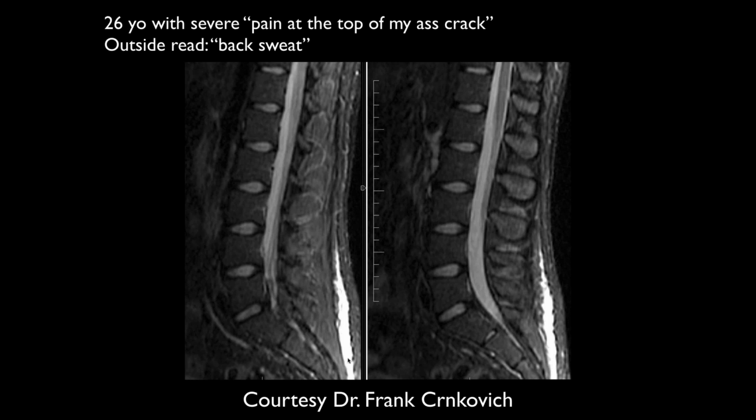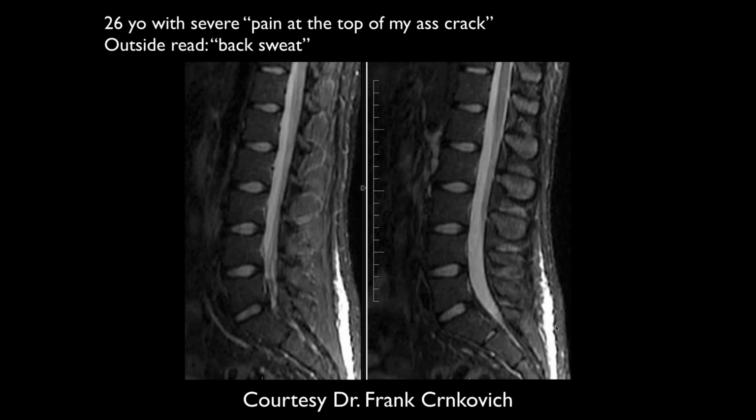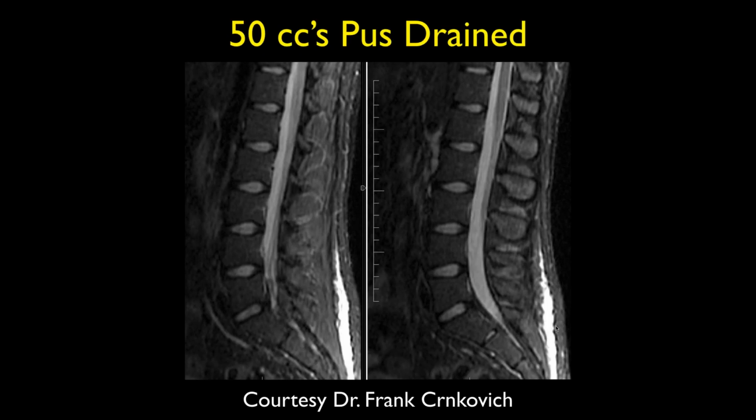So what's all this stuff? We go back again. In fat people, you see edema in the subcutaneous tissues all the time, especially back here. But this person doesn't have a lot of excess fat. This is right where the pain is. So they decided to stick a needle in this, and they drained 50 cc's of pus. So this was a subcutaneous abscess.